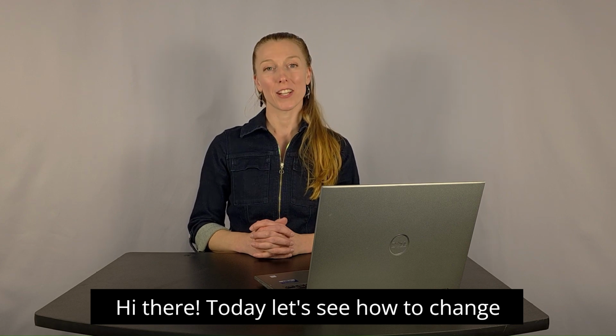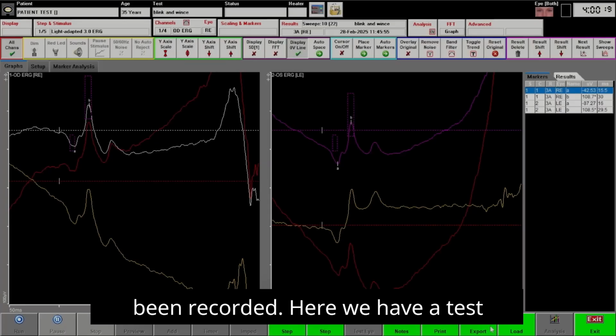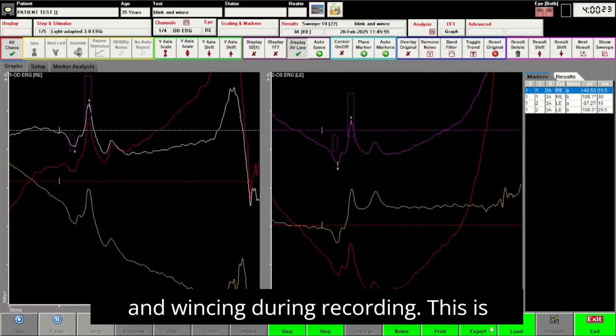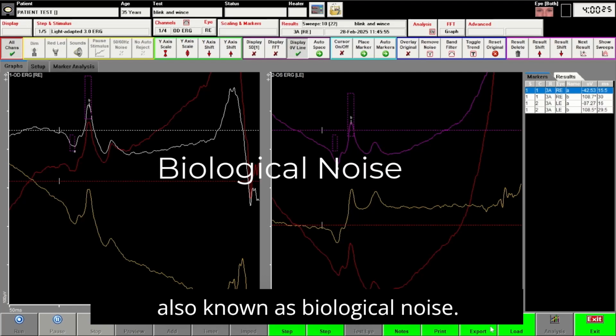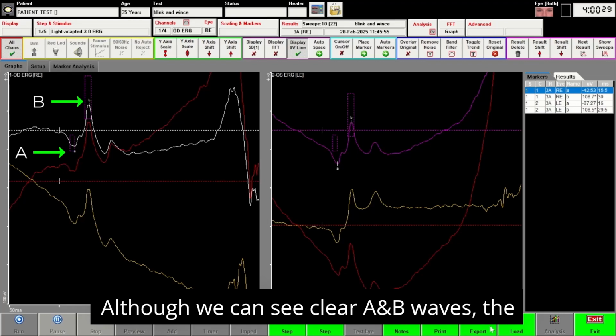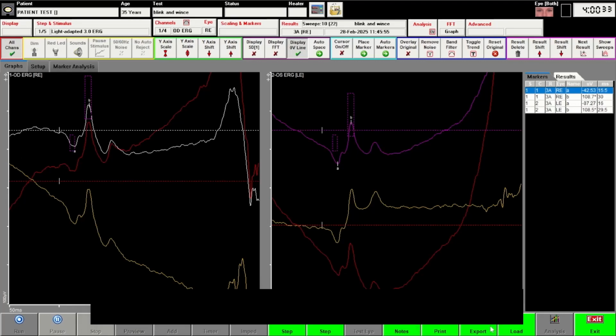Today, let's see how to change the bandpass filter after a signal has been recorded. Here we have a test example where the patient was blinking and wincing during recording. This is also known as biological noise. Although we can see clear A and B waves, the spread of these waveforms makes it difficult to interpret.